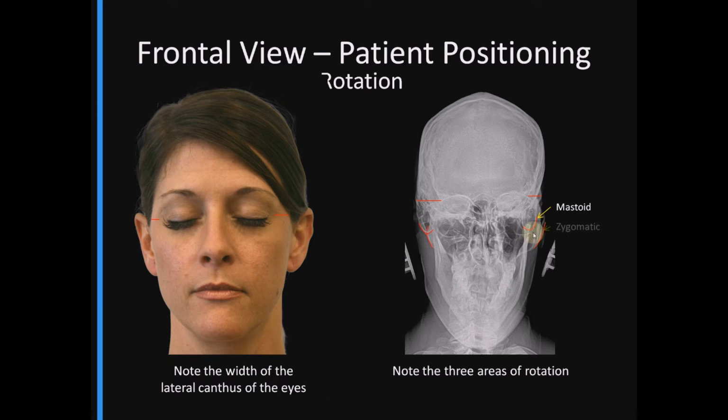We also talked about seeing where the cheekbone would overlie the mastoid on each side symmetrically if there was no rotation, but if there was rotation that was not accounted for in the placement, then the cheekbone would overlie the mastoid further than on the other side. And we also discussed the nasal cavity approximating the side of the C1 mass.